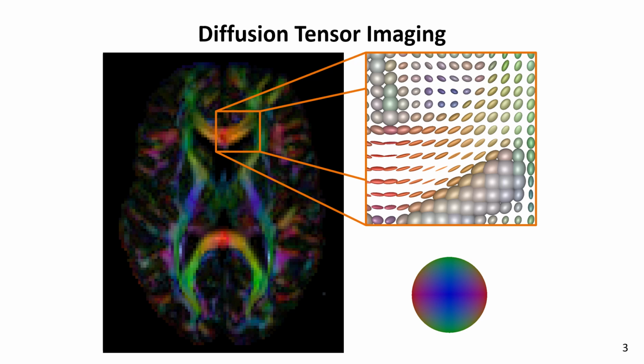DTI is an advanced medical imaging modality that is mostly applied to the brain. Unlike a thermometer, it requires not just one global value, but spatially resolved images. Therefore, whether or not a measurement is within normal range depends on its location within the brain. Moreover, it captures not just a single value per location, but rather a 3x3 symmetric matrix, the diffusion tensor, which corresponds to an ellipsoid at each voxel.